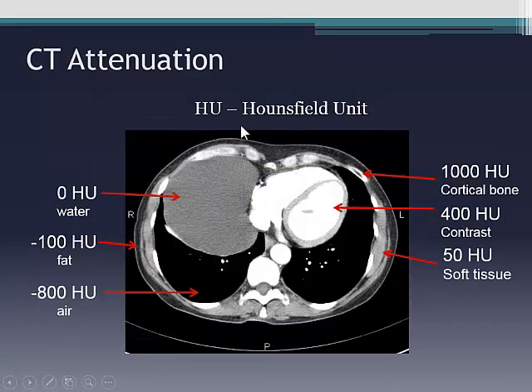Okay, so Hounsfield unit. You've already heard that the Hounsfield unit is just a way of quantifying the CT pixel value. 0 is water, plus 1,000 tends to be bone, and minus 1,000 tends to be air. Obviously, there's a range of numbers between that. Why it's important is, although the gold standard for tissue characterization remains MRI, CT can still give you very important information as to tissue characteristics, albeit not to the same resolution.